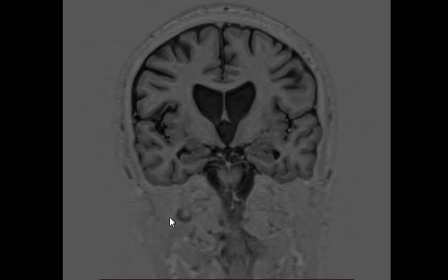So, what's your diagnosis? Not differential, your diagnosis. This is Huntington disease, a typical case. Keep it in mind: the box-shaped ventricle, the atrophic basal ganglia, and lack of signs of hydrocephalus. The ventricle is dilated, however, the sulci are normal or even exaggerated. You don't have a dilated ventricle with hydrocephalus with normal sulci.